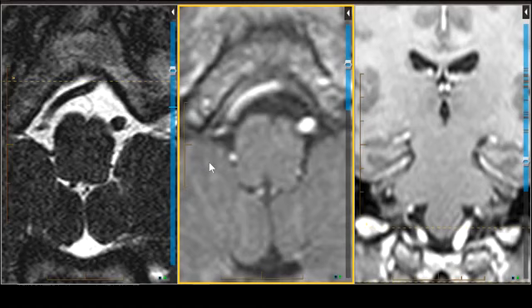As you saw in the last vignette, this nerve will penetrate the lateral mass of the occipital bone as the hypoglossal canal. To see the canal, you have to go down and a little bit lateral, which we'll do in a minute. There's the hypoglossal nerve, but I want to clarify one thing.